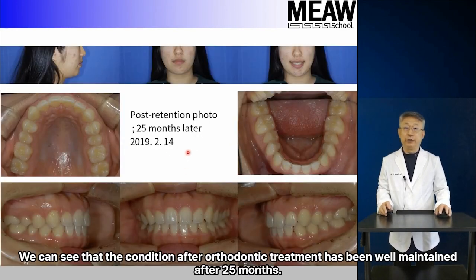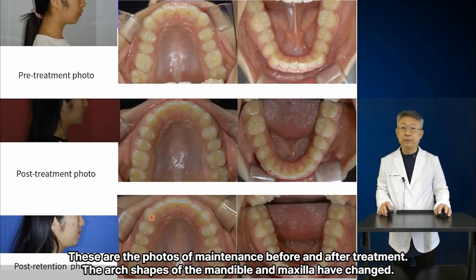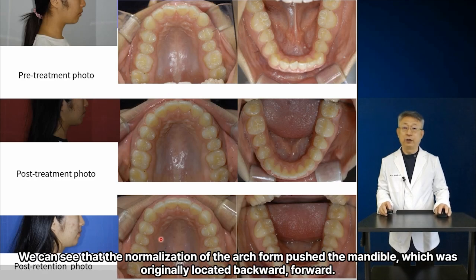We can see that the condition after orthodontic treatment has been well maintained after 25 months. These are the photos of maintenance before and after treatment. The arch shapes of the mandible and maxilla have changed. We can see that the normalization of the arch form pushed the mandible, which was originally located backward, forward.